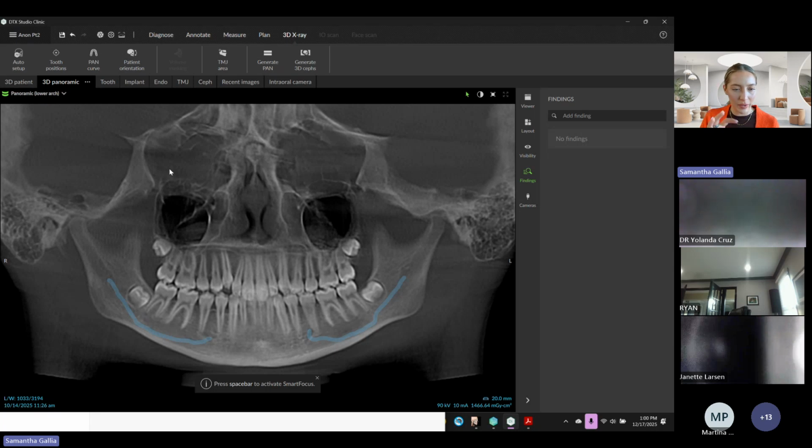And now I'm going to start by showing everybody. So we talked previously about the focal trough. That is creating the custom trough that is used to create our panoramic reconstruction. I'm going to briefly show everybody to go through and make sure that we like that compared to the one that AI did for us.